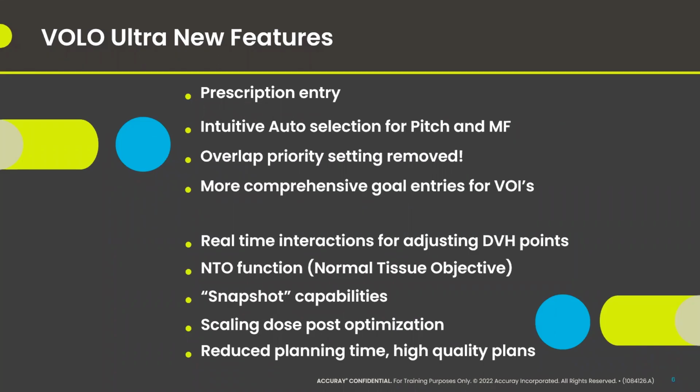Another popular feature that we've added is you can now rescale your dose post-optimization. This is a much needed nice addition, especially if you just completed your plan, your physician wants that full 95% volume coverage, and you're just short a few after your final calc. So this is going to be helpful with that, or maybe your physician changes their mind and they want a full 98% coverage. So this option will be available for you to rescale after you calculate your final dose.